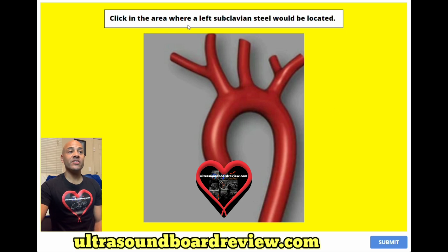Question 79. Click in the area where a left subclavian steal would be located. So where would you click on this image?